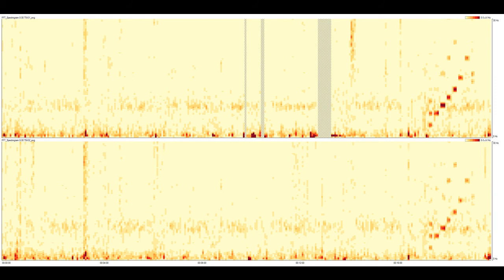First, it does not jibe with the electroencephalographer's visual gestalt of the frequency makeup of the EEG. The EEGer doesn't think in the expanded scale of a microvolt squared representation when considering the relative frequency mix of various EEG patterns. The second problem is that, for any given minimum and maximum values chosen for the z-axis scale, a power microvolt squared scale reduces the dynamic range of EEG activity that can be clearly rendered on the graph.